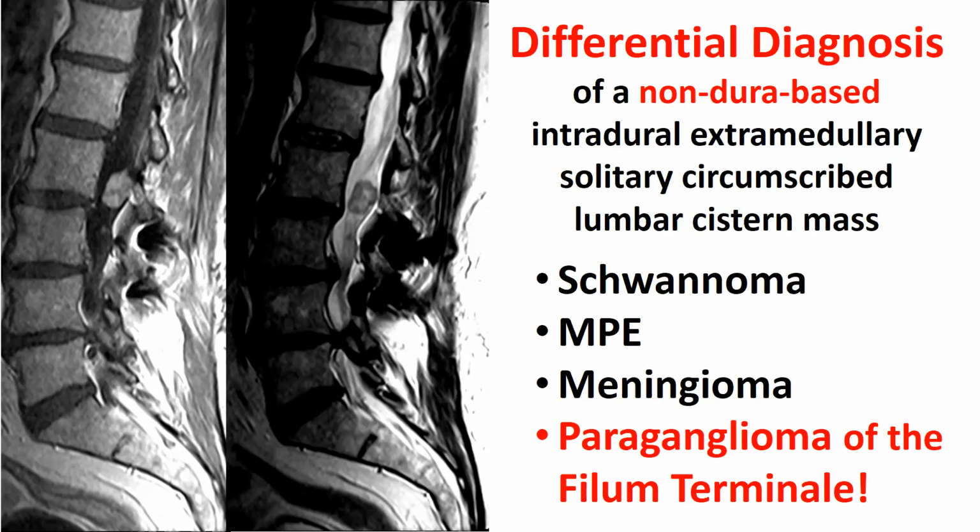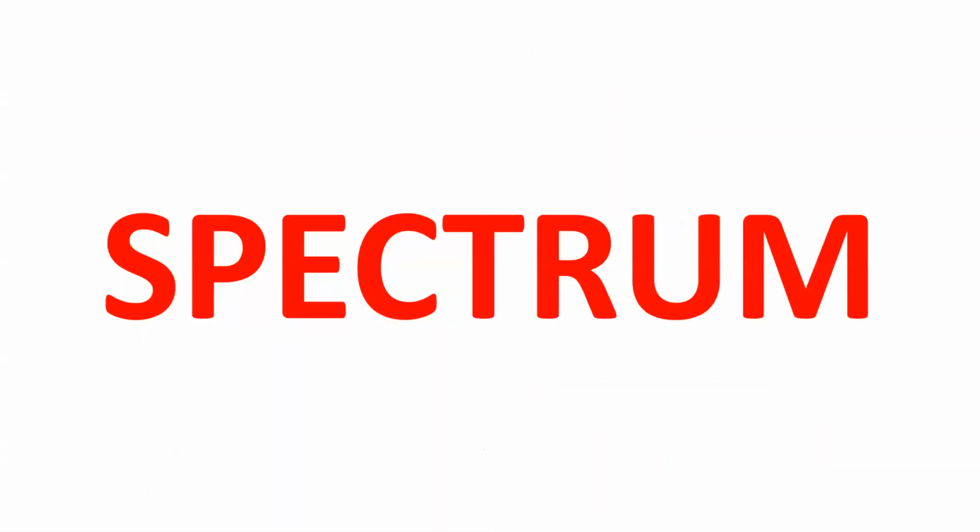Hey, now listen, quick question. I think Octavio, I think you said, I don't know if you can look at our case. Can you see on both images, there's a tiny little dot. Let's see if you see what for. See right here below, inferior to it. That looks like a drop metastasis, and that is exactly what everyone was thinking at tumor board, that this was going to be myxopapillary ependymoma with a drop metastasis. Guess what? It's not. It is a schwannoma. That may have been a baby schwannoma. It was not apparent. Okay, at surgery, it's all good.